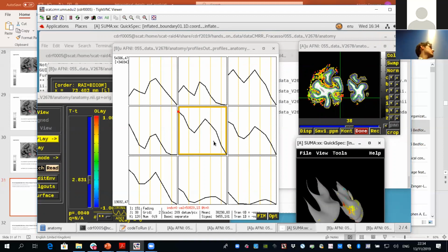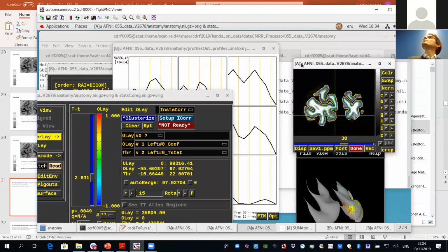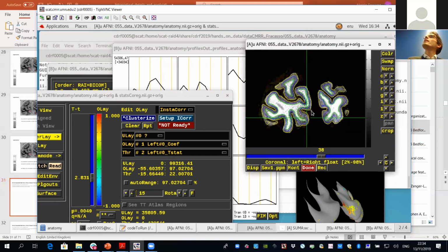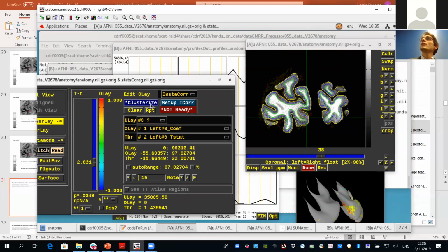This is the stria of Gennari, basically. And probably if I drop the, here is smack on top. Let me try to make it bigger so you can see my point. So this is volumetrically built. So this blue line, can you see this blue line in the middle of the cortical depth? There is a blue line here. And this follows a volumetric cortical depth, so is theoretically where layer 4 should be. But it kind of masks the underlying stria of Gennari because it's smack on top of it. So I'm going to remove it. And if I remove it, we should be able to see it.